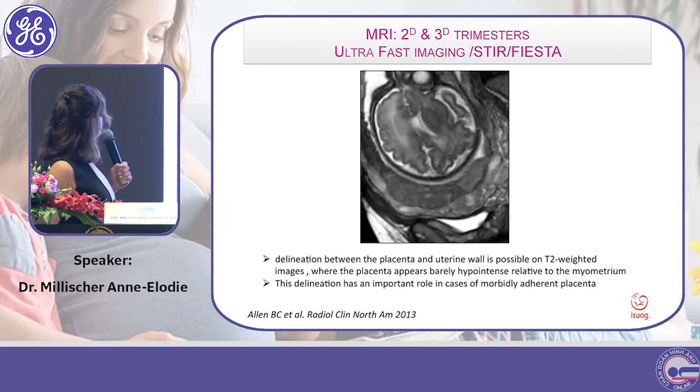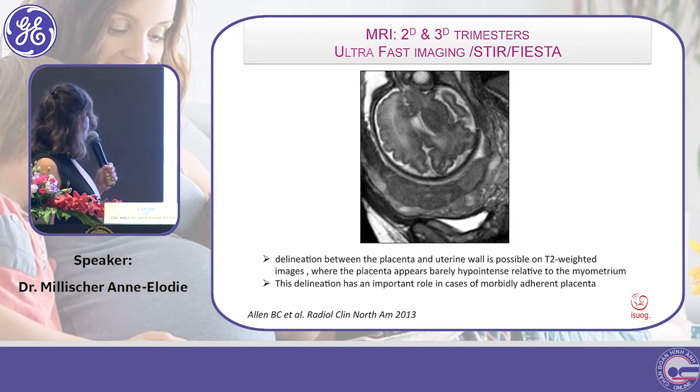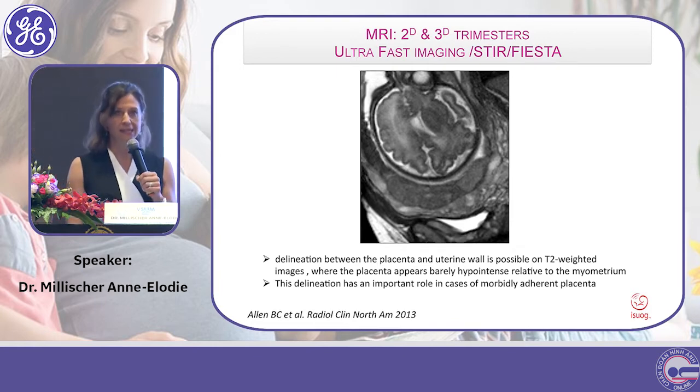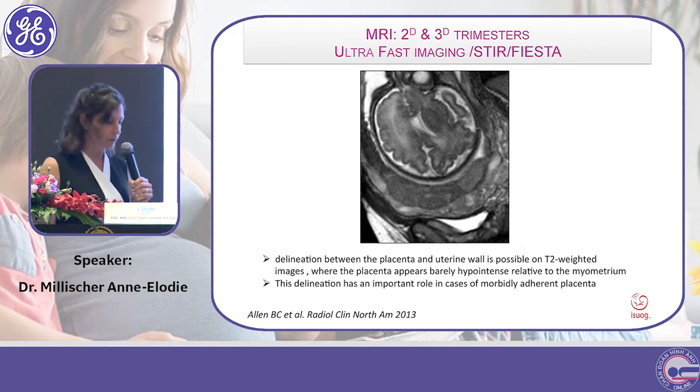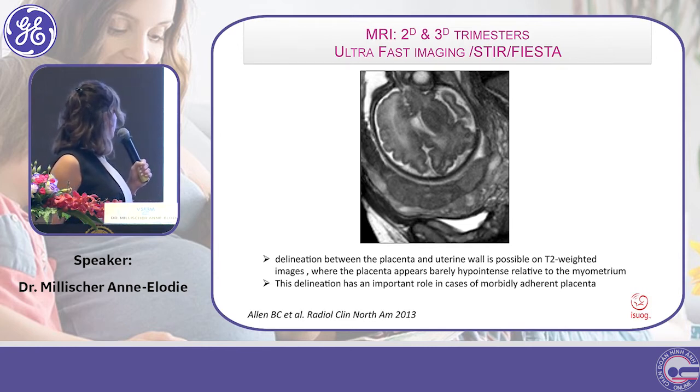So we were proposed to assess the morphology, the placental thickness, the echogenicity, of course the location, the cord insertion, and the most important thing is to prevent an abnormal placental adherence.